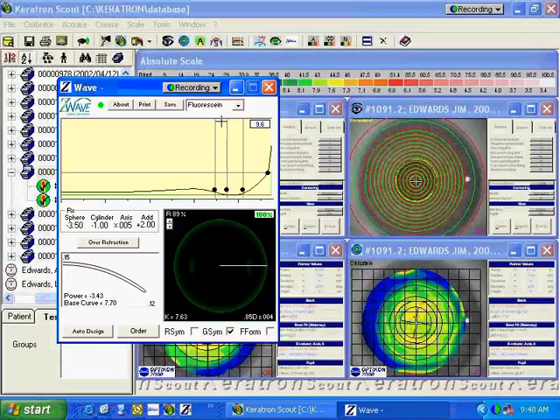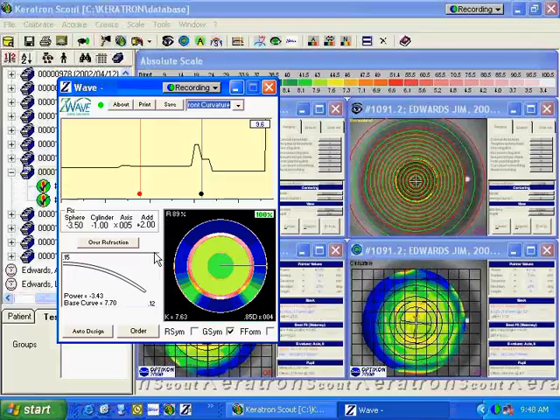We can look at the front surface of this lens and see the nature of the multifocal. The multifocal has a distance center design with an annular peripheral near design. The add is in a donut type of pattern, and distance vision is provided with this area in the center. The default distance center is a 3.6 size.